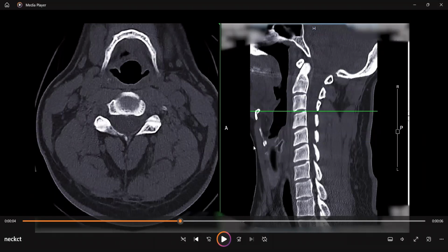If you have edema or some hematoma there, you want to look more carefully for the presence of a vertebral body fracture through an anterior osteophyte. Again, if you have a patient who's in a fluid overloaded state or anemic or third spacing, you can have some fat infiltration there normally, or if they've had radiation. But again, in a healthy patient, that fat structure should be clean.